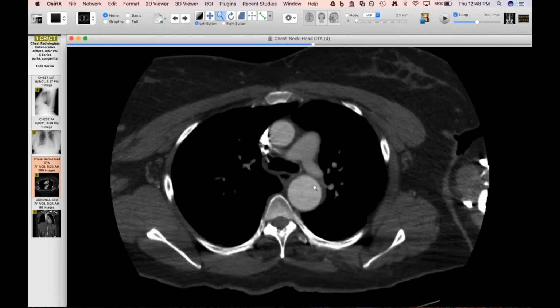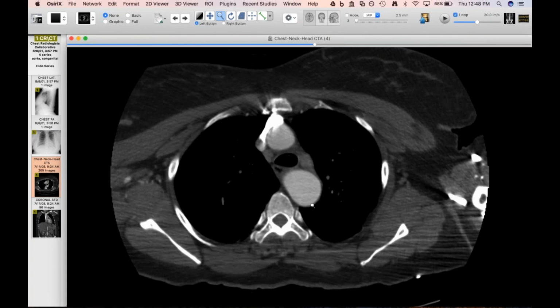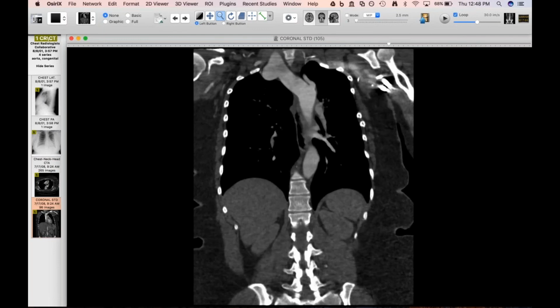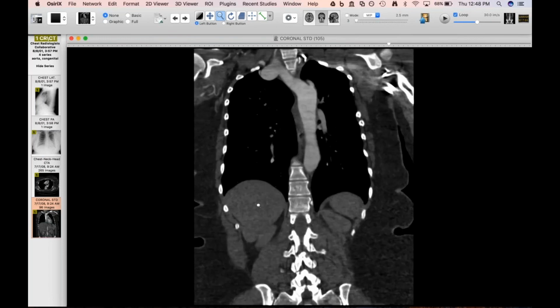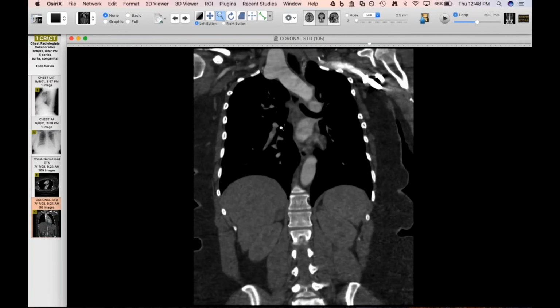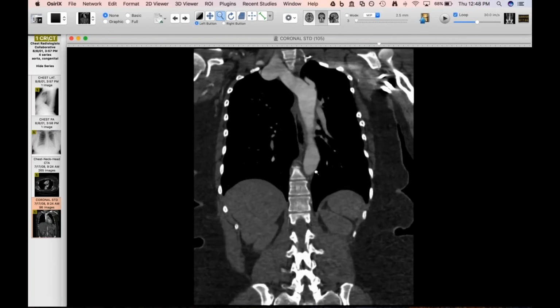Going back to the point I was trying to make before about a right arch being higher than a left: when you have a double aortic arch, the right arch is always higher than the left. It's almost always higher and usually larger too. That's a good point. So mine probably isn't a cervical arch, but it certainly is a weird variant.